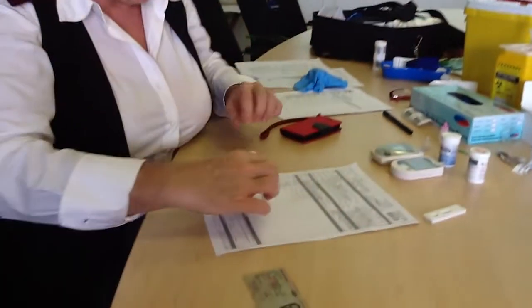Right, ladies and gentlemen, for the phase 2 part of the Rapids process, we're going to handle the recording and the reporting of your results now quickly. We are doing this at this point in time with either your cell phone, or if you have a tablet, that works just as nicely. So you will then take your client's rapid strip that you did now with a test.